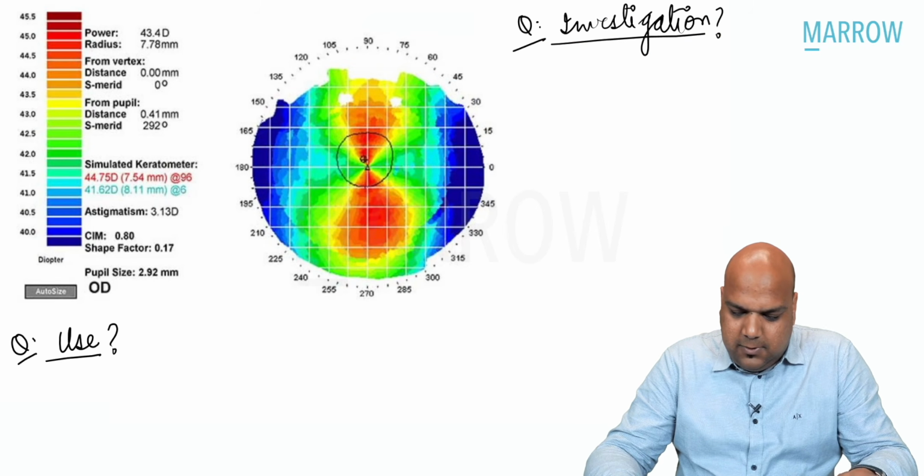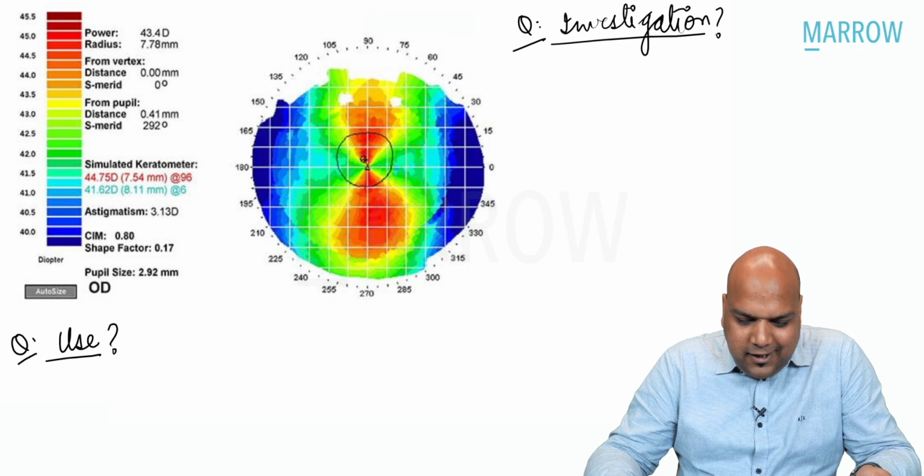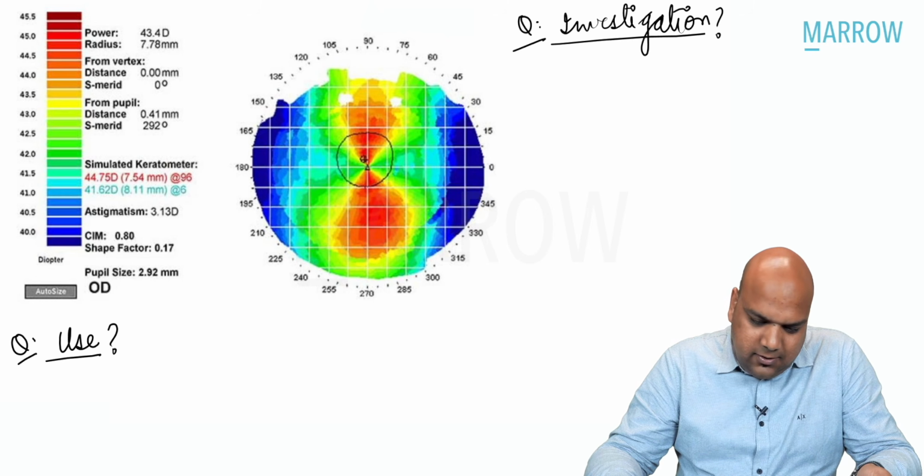Oh, okay. Colorful image. Wow. Wonderful. In the eye, a colorful image is rare. We usually work in black and whites. So what is the investigation here? Sir, I don't know. No idea, sir. Oh, is there any clue, sir?